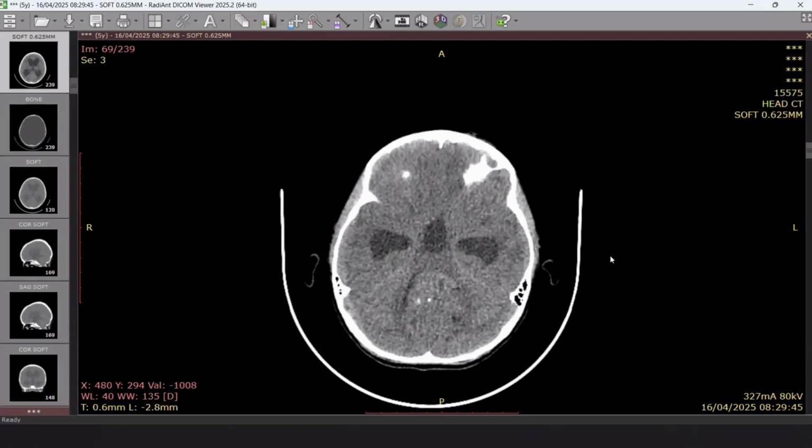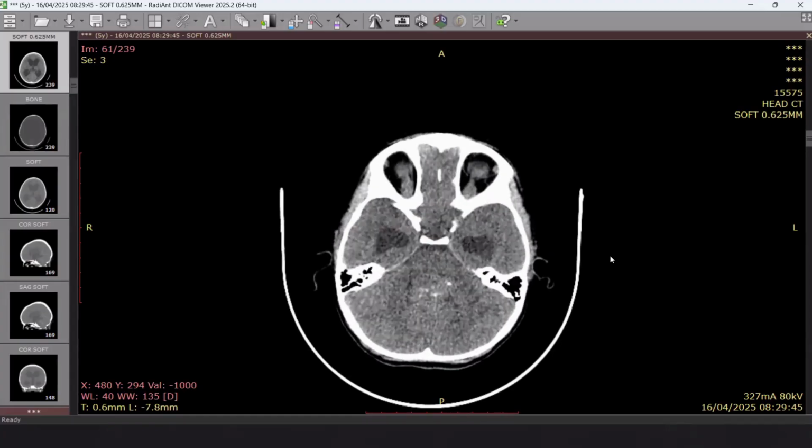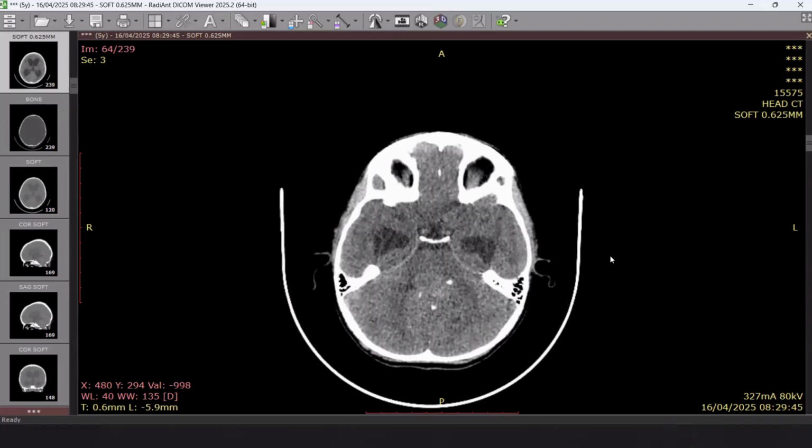The hyperdensity is suggestive for what? For which one? Medulloblastoma or ependymoma? Yes. And the calcifications are suggestive for which one? More with ependymoma, I think. Yes, you are right. Very nice. Okay, we will review these points later on.